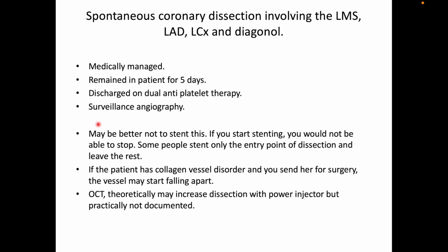toothpaste effect. So what happens is, if you press the toothpaste, it moves forward. So the same thing can happen here in this intramural hematoma and SCAD, that once you try to do a stent, that stent may squeeze the hematoma further forwards or even backwards retrogradely. So some people stent only the entry point of dissection and leave the rest so that they close the entry point. If the patient has collagen vascular disorder and you send her for surgery, the vessel may start falling apart. It becomes a nightmare for the surgeons.